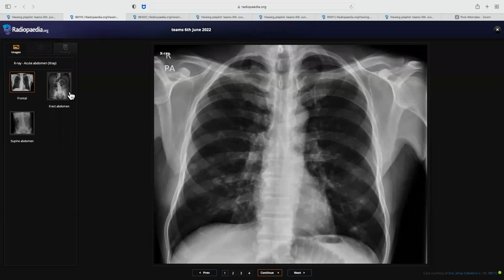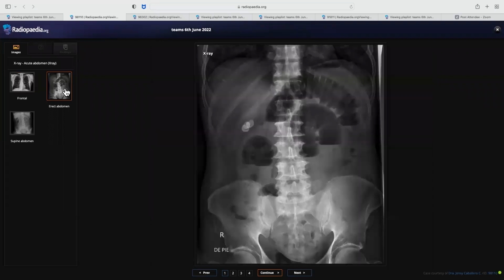Okay, fine, thank you. So in my routine practice, I would check these on an orthogonal view, inquire about the detailed history of the patient, and check the old records on the PACS to see any interval change in size or any prior disease. Yes, keeping in view a known case of a disease. Right now the patient presented with severe abdominal pain. We just did a chest X-ray as a part of the study, but there is an abdominal radiograph available if you can see and comment on that.